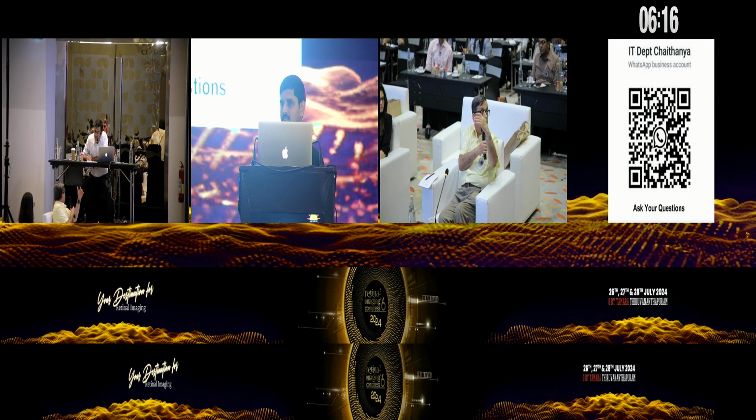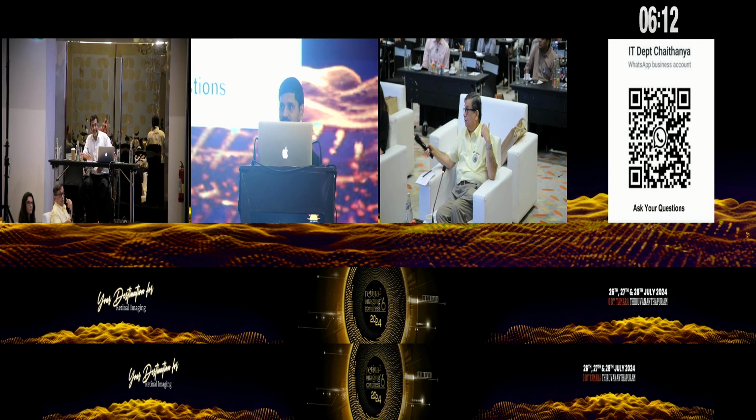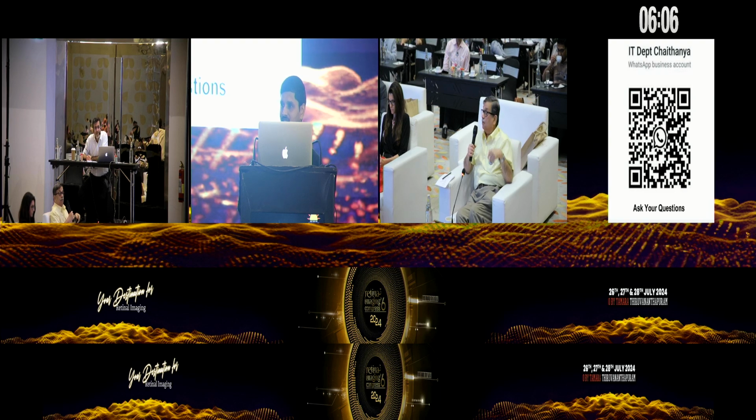Pradeep, do you want to take this? In this case, OCTA showed the presence of a network. I haven't included that image; I have only included the flow signal over there. The en face OCTA also showed the presence of a network. And it has shown progressive growth despite PRN regime treatment. We have seen that the network is still there and has shown some growth actually.